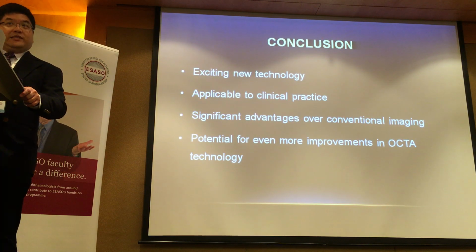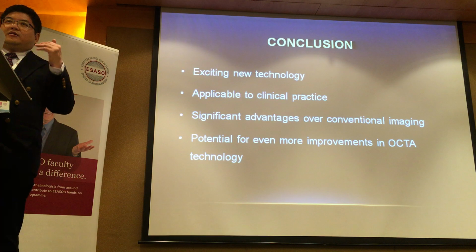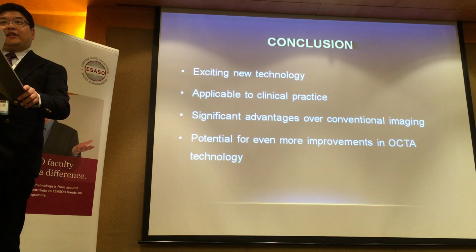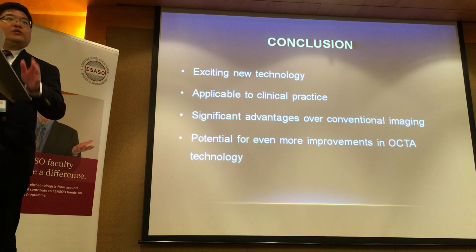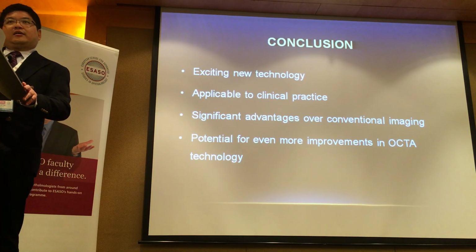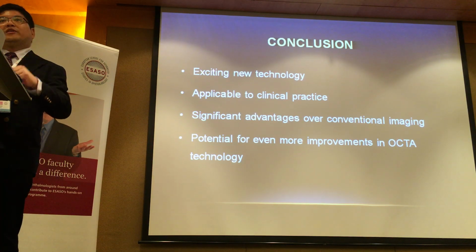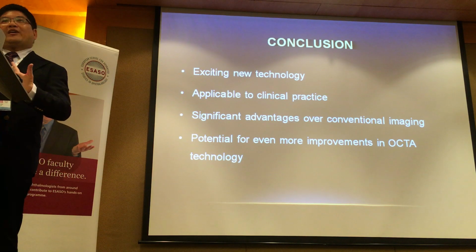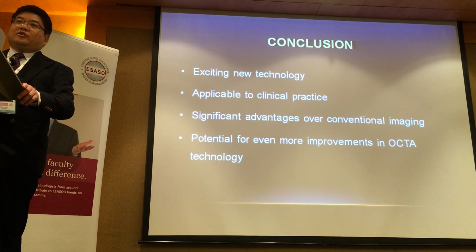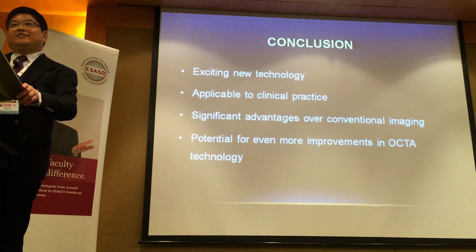OCT, as you know, uses light waves. And so light rays. So basically, hemorrhage or any kind of opacity will block the transmission of light. So what you need to do is correlate this clinically. And same with the fluorescein angiogram, the hemorrhages will not respect vessel boundaries. It will spill over. And if it corresponds to an area of hemorrhage, then it's more likely. But you're right, there can be areas of obstruction if the hemorrhage is sufficiently thick.